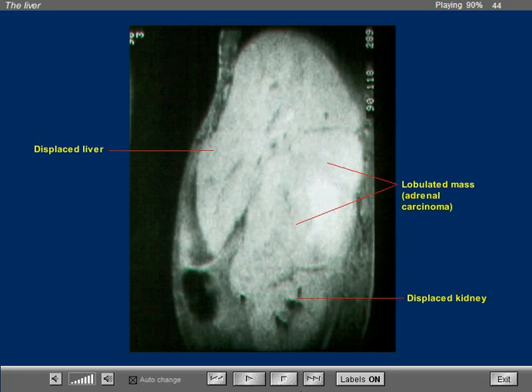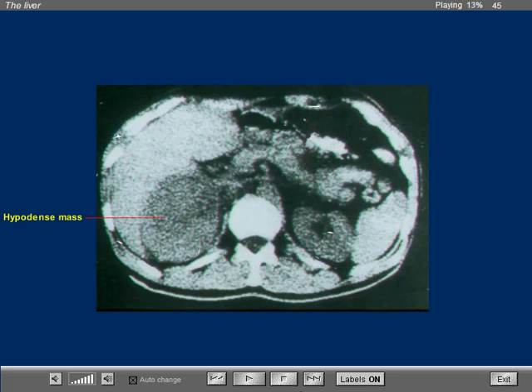This is a case that was given to me by Dr. Hrichak many years ago. In this patient, we note that there appears to be an irregularly hypodense mass in what appears to be the right lobe of the liver. Is this really the liver?